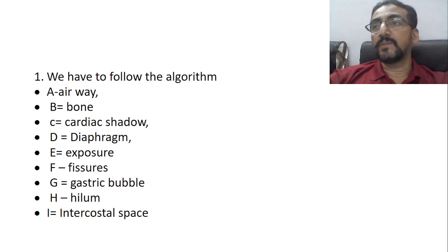So that is the position of the diaphragm. The diaphragm itself forms some of the angles in the X-ray. One is the costophrenic angle, another one is the cardiophrenic angle. Now, in relation to the diaphragm, you have to also look into these costophrenic and cardiac angles that we will discuss.